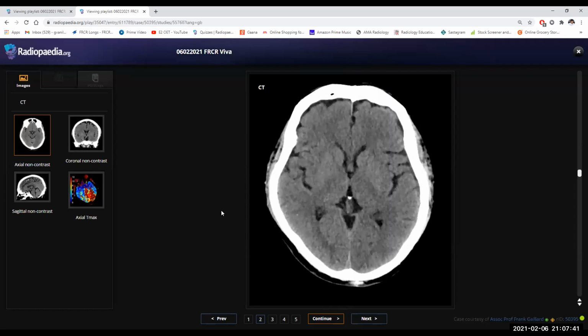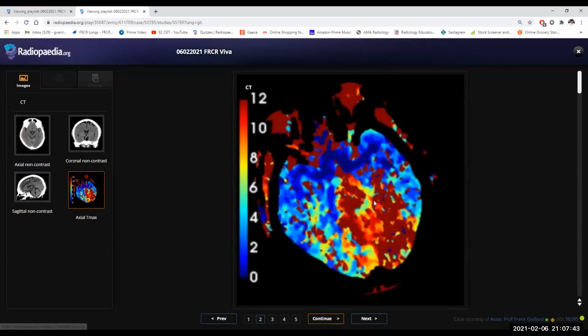Yeah, one second. They have done the perfusion study and this is the finding. I am totally unexperienced in it, but I'll have a go. It's okay, no issue. I believe that the abnormal area is being shown by this reddish area in the map.